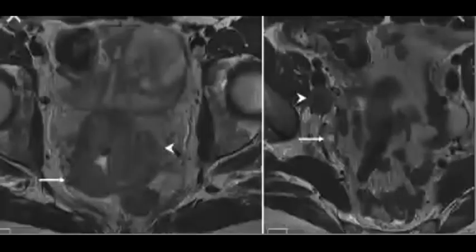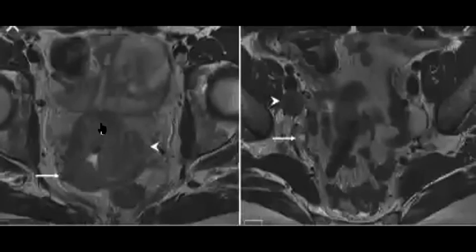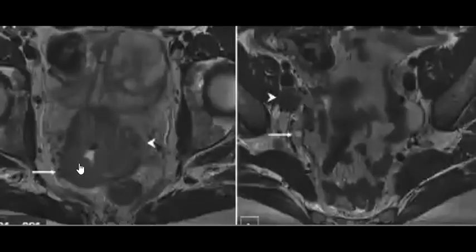You see, there should be one ring surrounding the cervix, which in our case, but is sagittal, this ring, which is a low signal ring. But when it's disrupted, the mass is going outside, and when it reaches the pelvic wall with hydronephrosis, you are going to mention that it will be 3B. Okay? Is it clear, or do you need more examples?